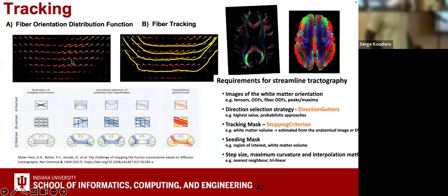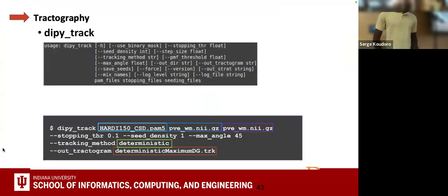So here you can see, up here it's straight away. Even with your eyes, you can do tractography. It's very obvious, and it's a nice area. But some areas are not like this at all. They are combined with multiple directions, and so the whole field is working on how we can guess, how we can get enough information to take the right decision on where to go. So here is a nice presentation. Here is a ton of crossing. What do we do? Many people are working on this to improve tractography.